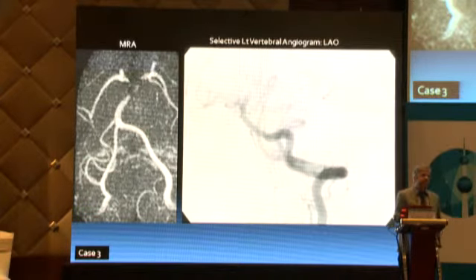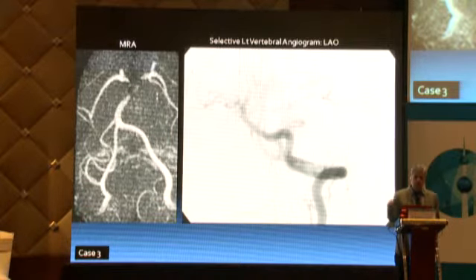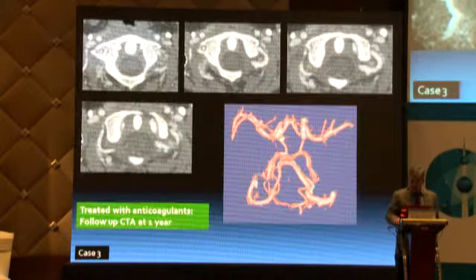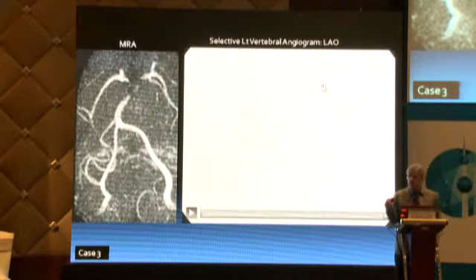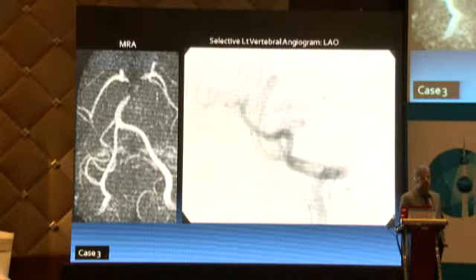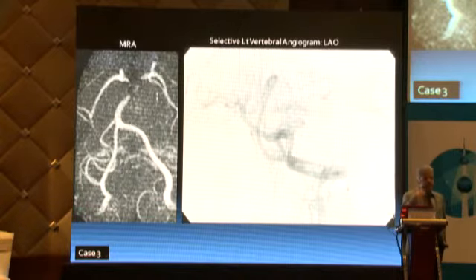So teaching point over here is any posterior fossa infarct in a young adult, you look for this area of the vertebral artery, that is from OC1, because vertebral artery dissections are a common source of posterior fossa infarct. So anytime you see posterior circulation infarct in a young adult, always look at the vertebral artery in the upper neck from occipital bone up to C2, because as it swings through C1, C2 to go up into the foramen magnum, that is where it gets injured or gets dissected.